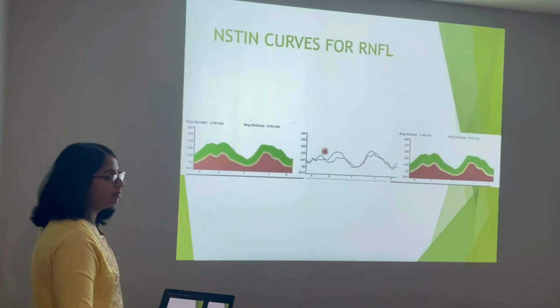Then there is a floor effect. Seen in advanced glaucoma, the machine cannot detect an RNFL thickness of less than 50 microns. It is due to the residual glial tissue of the optic nerve. So in advanced glaucoma patients, we can't use the OCT for analyzing progression because the value will plateau at 48 or 50, that range. So in advanced glaucoma patients, only visual fields are significant.